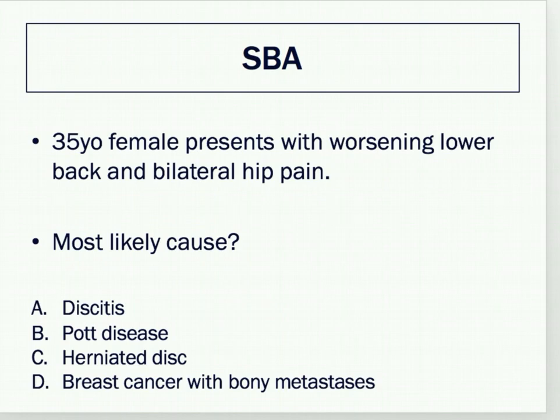Okay, so now we'll finish with an SBA question. I'm not going to give you too much information because I want you to have a look at the scan and pick up on the clues in the images that will point you towards the most likely answer.